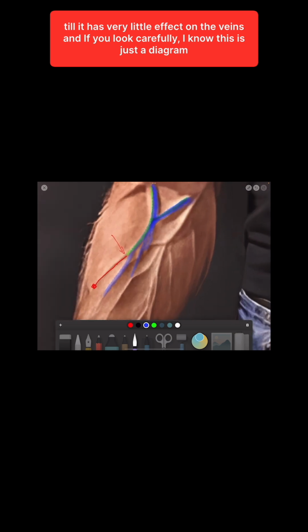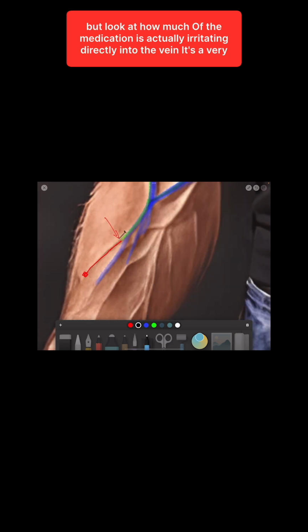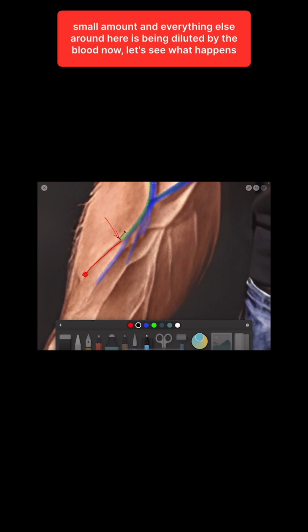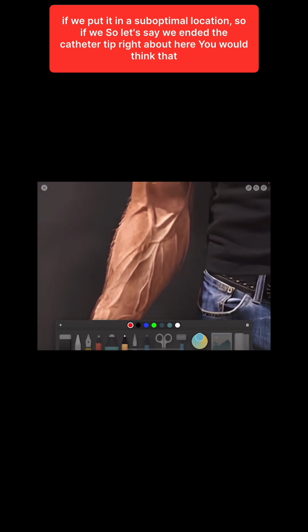And if you look carefully, I know this is just a diagram, but look at how much of the medication is actually irritating directly into the vein. It's a very small amount, and everything else around here is being diluted by the blood. Now let's see what happens if we put it in a suboptimal location. So let's say we ended the catheter tip right about here.